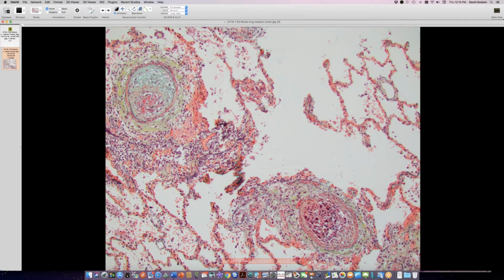And this is courtesy of Dr. Marshall, our autopsy pathologist who presented this case earlier this week. So we have all of these little intravascular things here. So we have these microscopic intravascular thrombi. This was not thromboembolic disease. This is in situ thrombosis. And there is some angiopathy, some inflammation, I guess, and thickening of the arterial wall around these little central lobular thingies here.